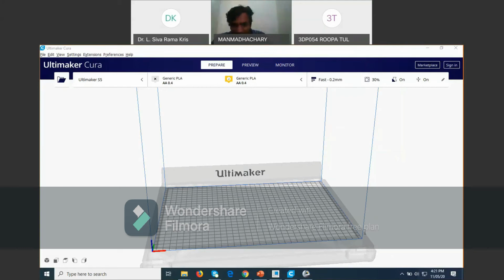Where is it, sir? The last chart. Generally, free online converters will not be as efficient as the professional one, but still it may serve your purpose. Yes, sir. Actually, compared to Mimics, this STL file is also not good.